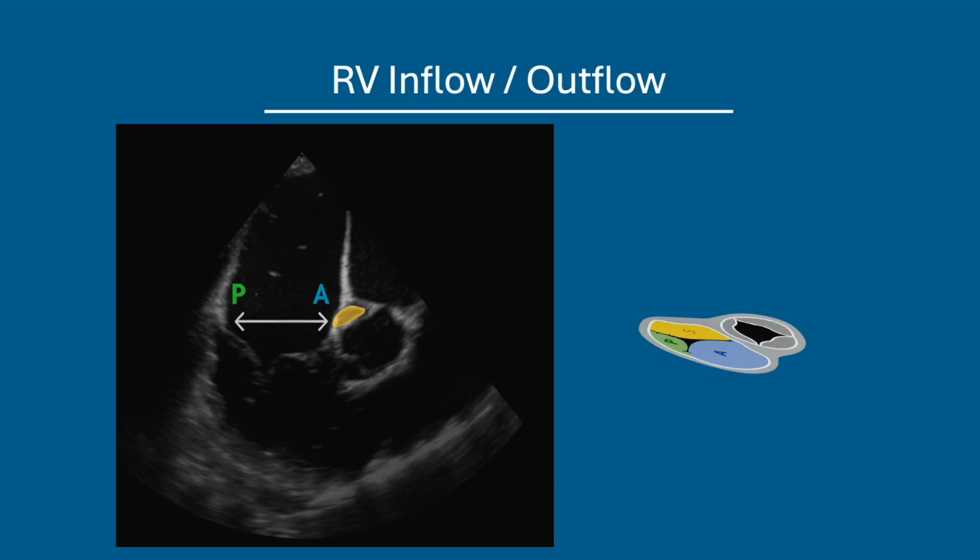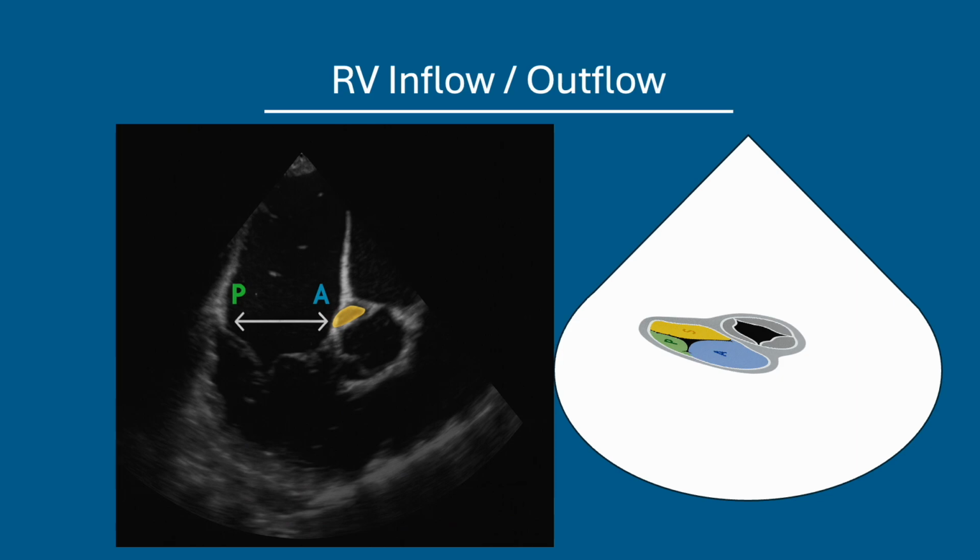To further our understanding, let's tilt the plane of the tricuspid valve so that it is in keeping with the plane of the tricuspid valve in the RV inflow-outflow view. Let's also imagine that this is now a TEE ultrasound sector and place a multi-D cursor through the anterior tricuspid valve leaflet. You can see that this cursor will cut through the septal leaflet in the orthogonal view.